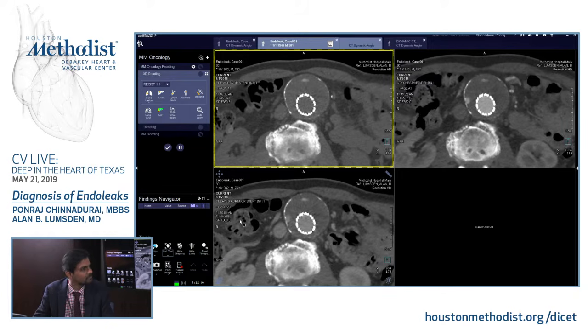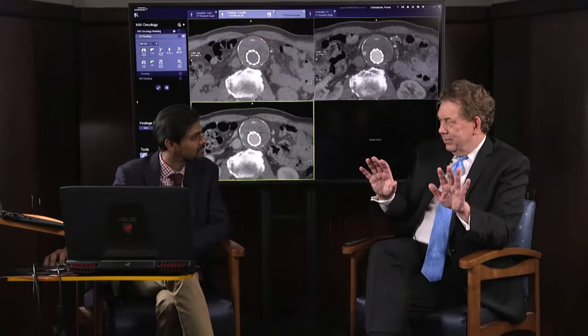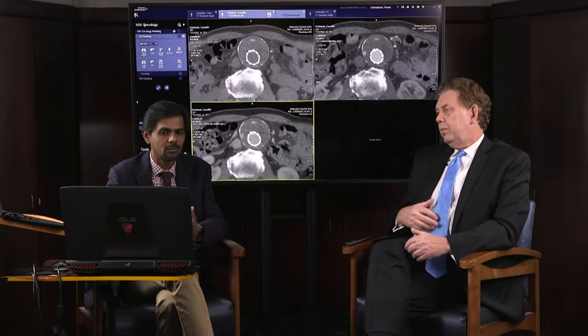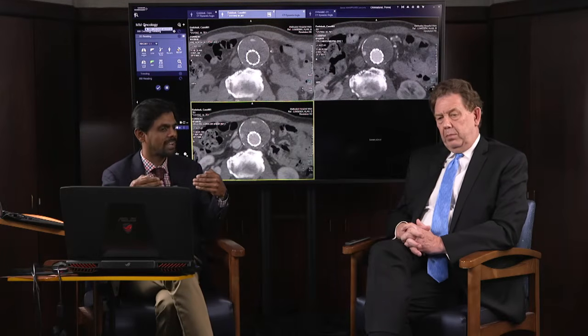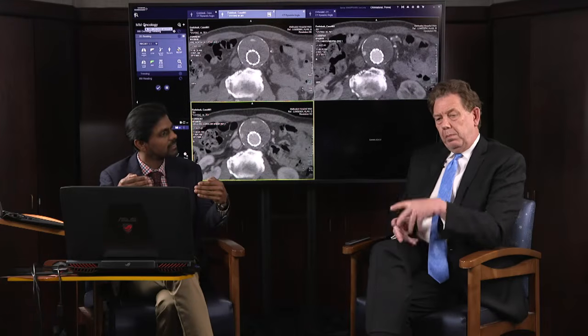Let me ask you one question, because you have these synced side by side, comparable slices. How do you do that? We have certain workflows where, because the patient didn't move during the scan, we know exactly which slice position corresponds in the non-contrast to the arterial to the delayed phase. So these are all, I would call it, time synced for now.